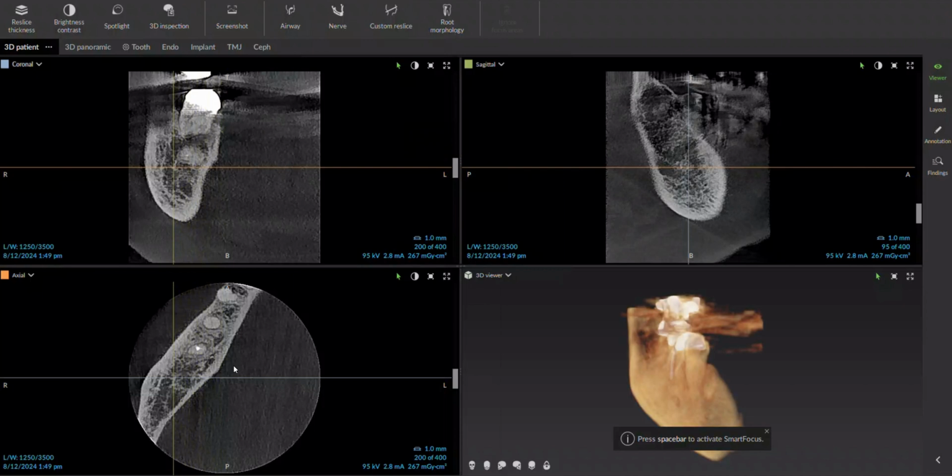With that said, it's important that we understand that the information that we gather is properly diagnosed. So we are responsible for the information that's in there. So I always go through and make sure that I'm trying to look for aberrations. The more and more that we look at these images and these image sets, the better our eye gets at it. No different than we found things in 2 dimensions that we maybe didn't see the first time we looked at a PA. But really, we want to take a look at number 29 and 30.